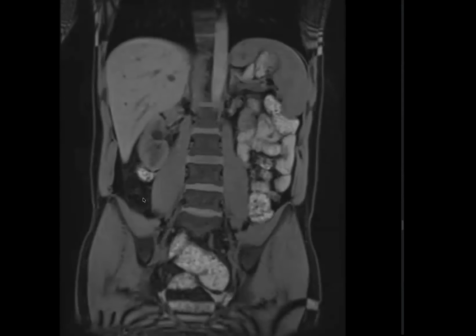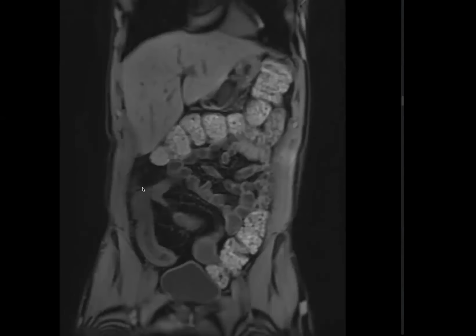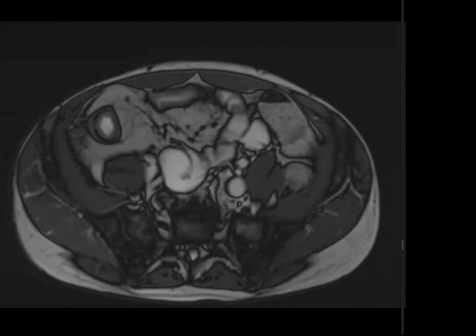Was it? Let's see. Yeah, it's right next to each other. There's probably multiple colic fistulas, but even if you can't demonstrate it on the picture, in this exam, as long as you tell them that this is making me suspicious for a fistulation, and even in real practice, sometimes we can't see it, but we describe it exactly like that in our report. Bowel loops next to each other, lots of inflammation, possible communication, can't exclude an underlying enterocolic, enterocutaneous, enterovesical, any type of fistula. So they want to know that you know about these complications and you're actively looking for them.